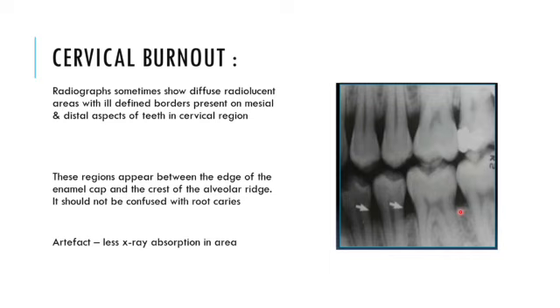These regions appear in between the edge of the enamel cap and the crest of the alveolar ridge, and it should not be confused with root caries. It is an artifact and it is due to the less X-ray absorption in this area.